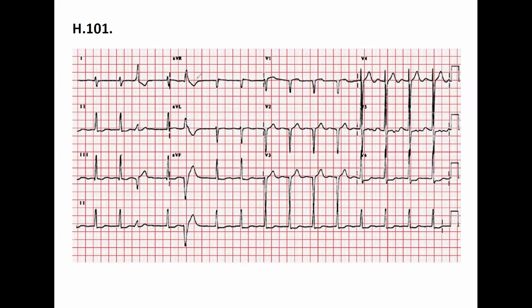I cannot see any P wave right here. So this way you should go to the chest leads. In V1, we see nothing. V2, well, maybe this one can be. In V3, V4, very nicely, you can see it in V4 or V5, for example.